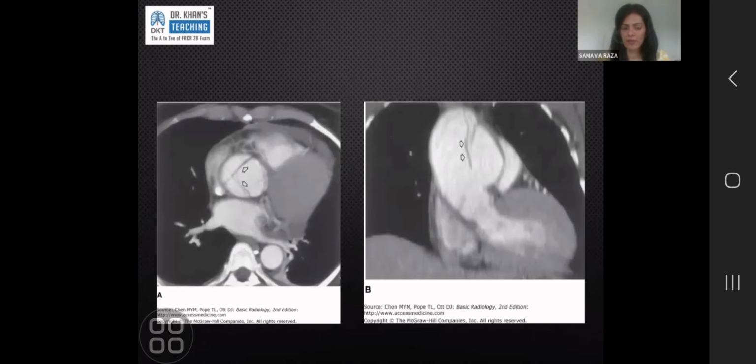Don't discount it as artifact just because you're used to not noticing that part of the aortic root too much. Obviously, if it's a slower scanner, if there's a lot of movement artifact, this becomes less relevant. I don't want you to go ahead and start overcalling everything, but be mindful that not everything that looks like an artifact is an artifact.